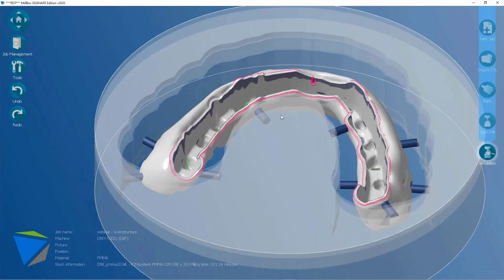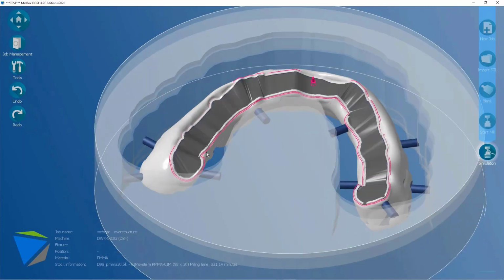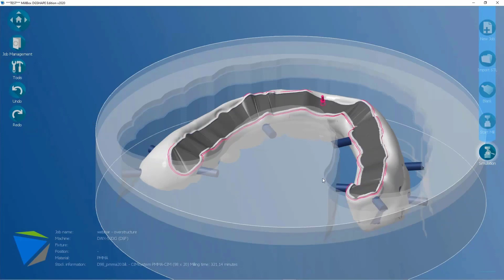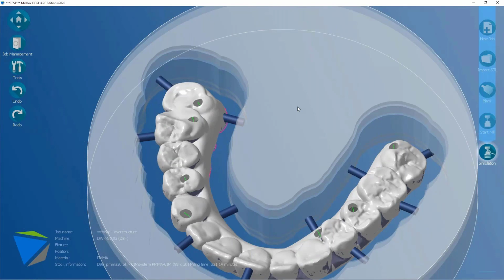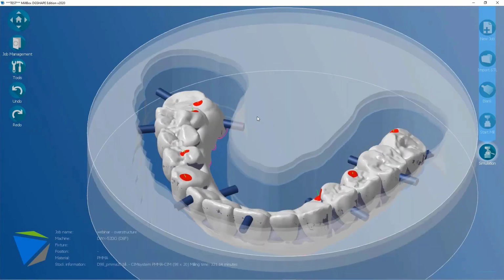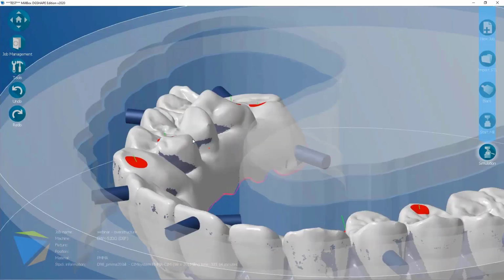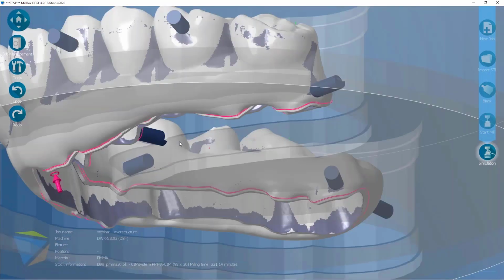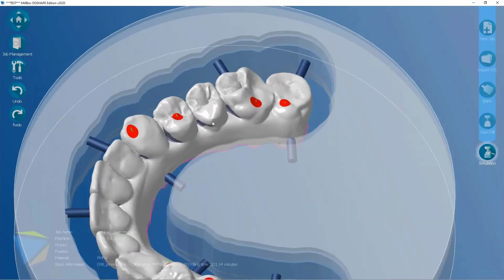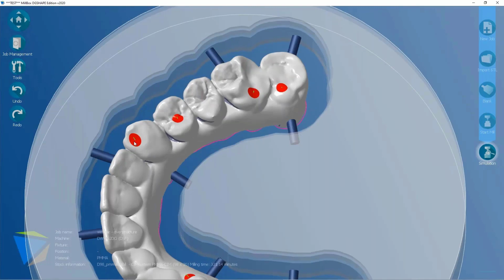Here, Control G. By using the hotkeys, I remind you that we can even see all the caps automatically created during the import. Even if I click on Control R, like red, I can see the red caps, which are going to close the holes, automatically managed to prevent any entry inside here for non-necessary operation, and that's it.